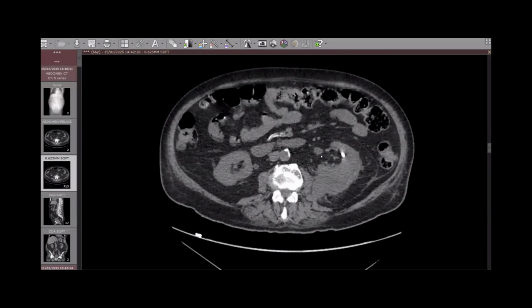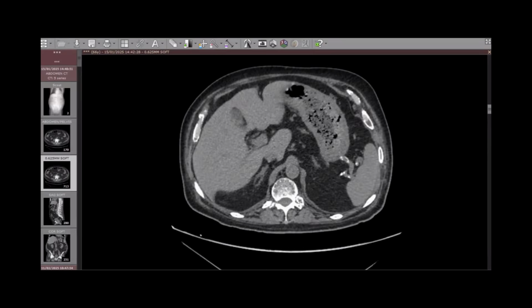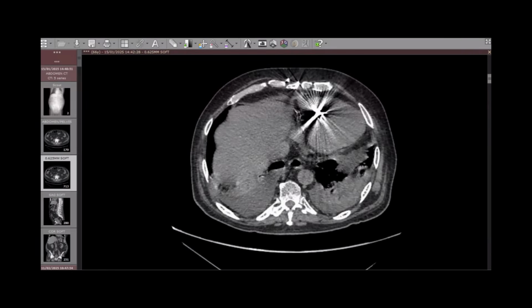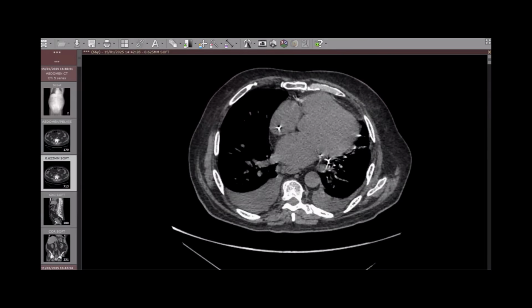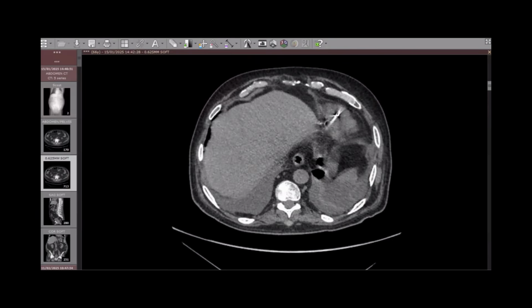This patient came to the ER complaining of left side acute loin pain. We did a CT scan to search for any ureteric stones or something like this. This is an axial cut CT for the abdomen without contrast. I will scroll and then I will comment.